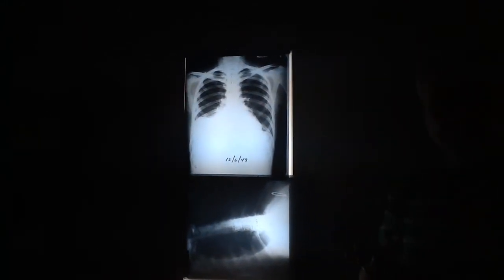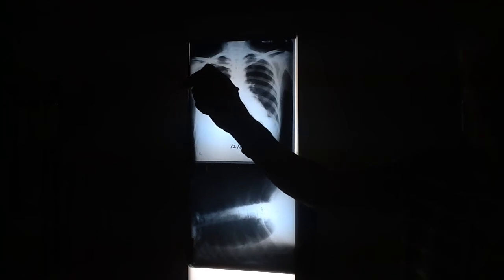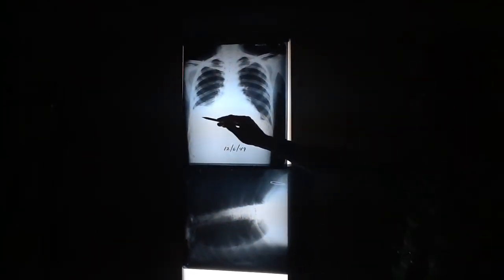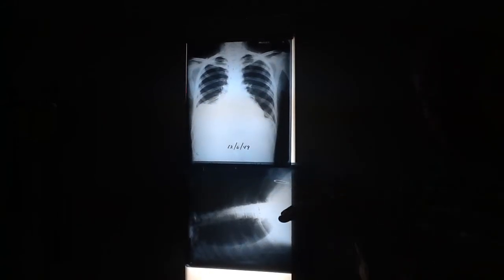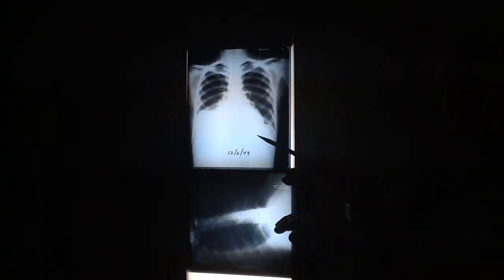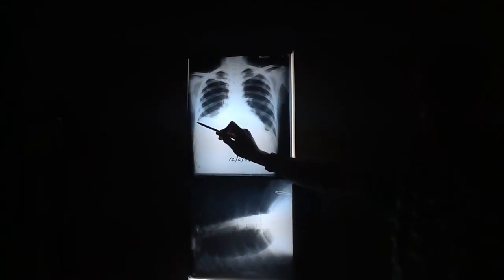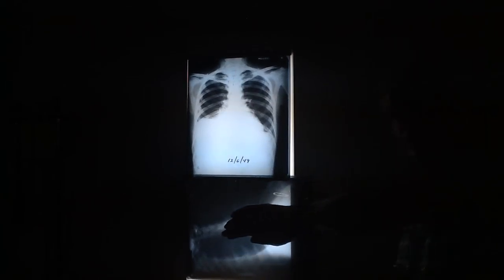They just do. Most people do it like this: it just puddles in the costophrenic angle and starts coming up. This happens very symmetrically over the diaphragm and just lifts the lung base off the diaphragm. And it looks like they still have a costophrenic angle over there. If we looked on the posterior, it would look like they had a posterior costophrenic angle. It's a very strange pleural effusion.